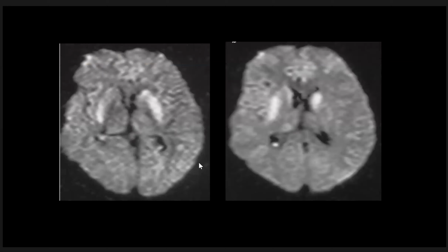As we see here, patient with cardiac arrest after 3 weeks, and we see hyperintensity of the basal ganglia with diffusion weighted images.